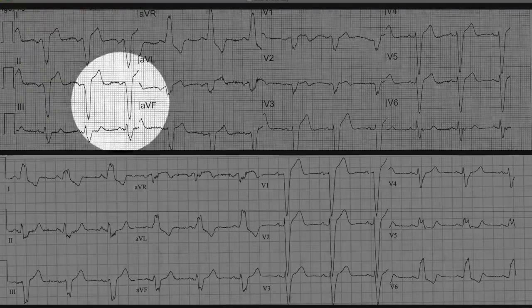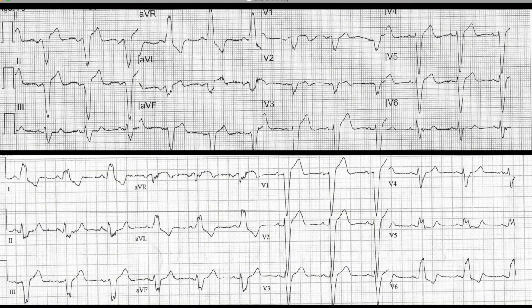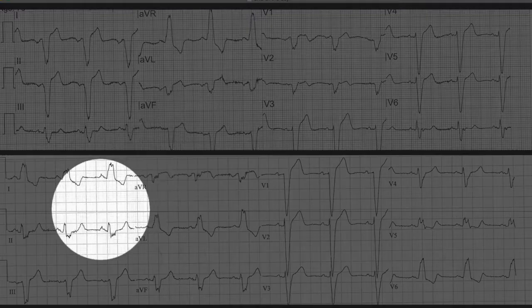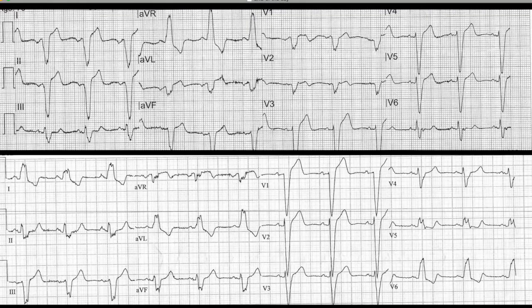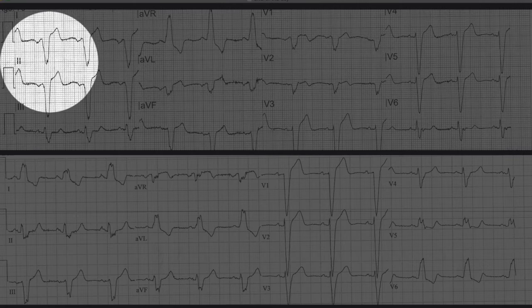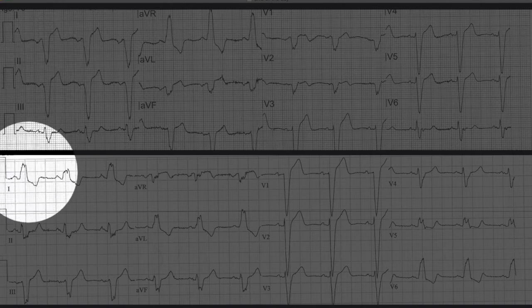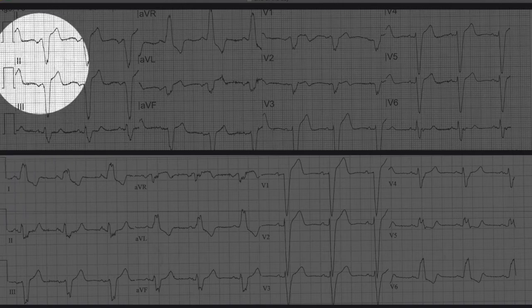Because when we look at this EKG, this top portion is the EKG that was transmitted in. This bottom portion is the EKG after we saw the patient in the emergency department, made sure the limb leads were replaced in the right way, and reran an EKG. Is that what it looks like happened? So again, what happens? Lead 1, this is the old one, should flip. Does it flip? Yes, it's that same morphology, but now it's upright instead of down.